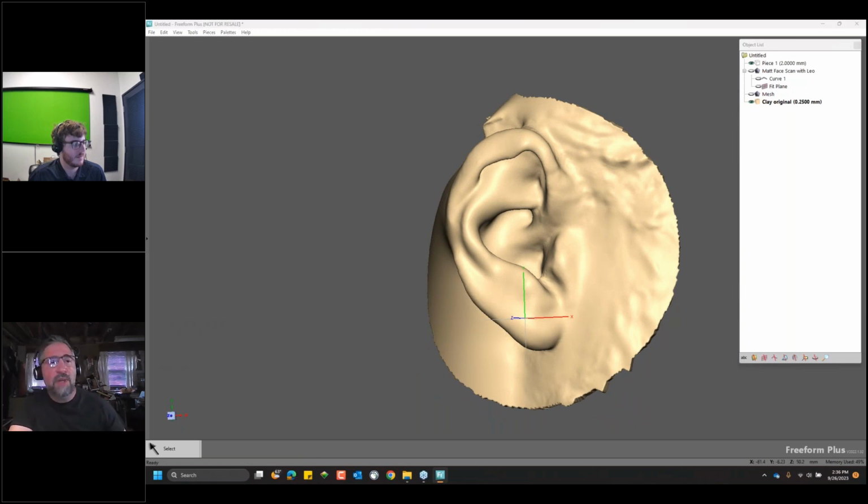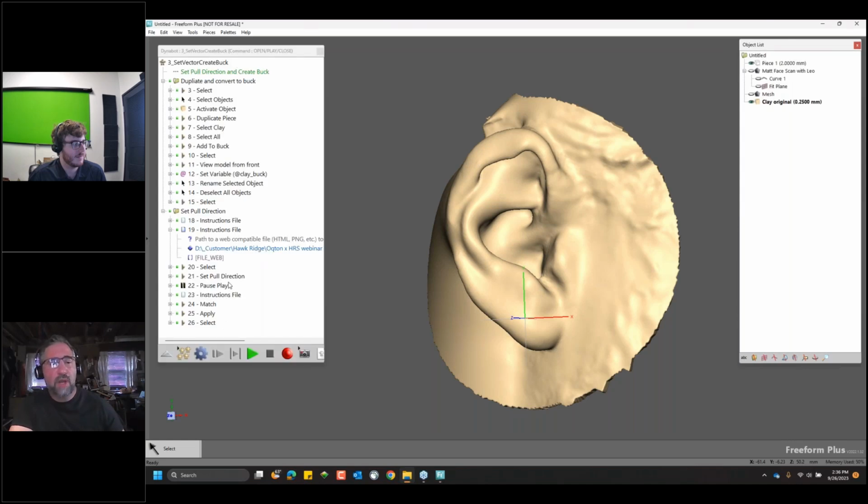Right now, each of these are in individual scripts. These can all be combined into a single workflow that you can progress through, but having them individual does allow you to stop and go back or interrupt your process if you need to. So there's a lot of flexibility in here.